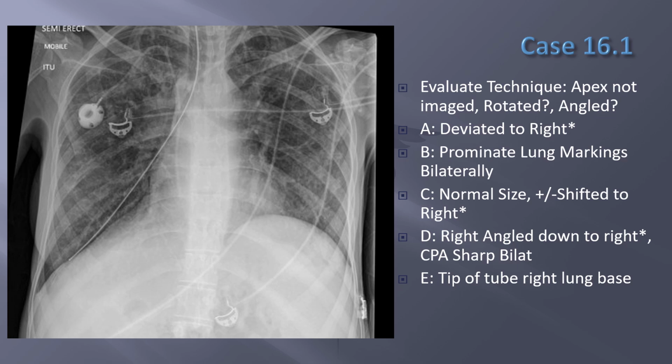But we have this gastric tube that's coming down here, right down the trachea, right down the right main stem, all the way to the distal airway to the right base of the lung. So this is a malplaced gastric tube. So this is where you want to mark, if you're hitting like 45 and start hitting resistance, then I wouldn't push it anymore and just kind of figure out what you're doing. You can put some air down the syringe into here with your stethoscope over the stomach. We don't hear anything. You're in the wrong spot. So this needs to come out.